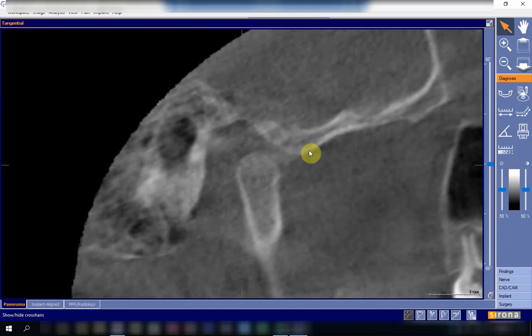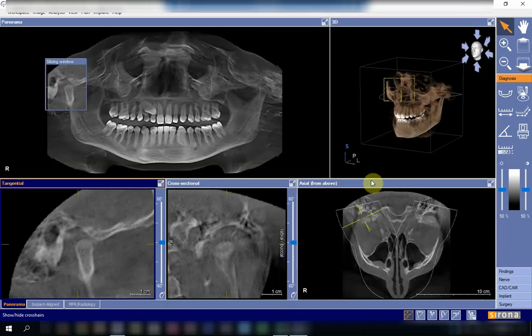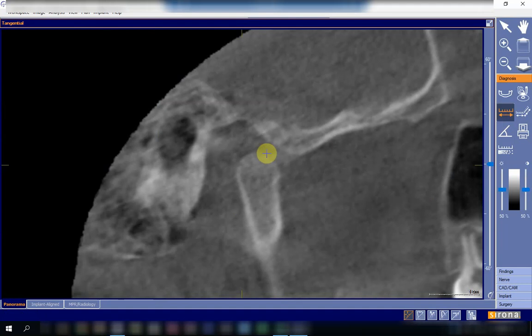You will look for the same criteria that you were looking for here. One is the integrity of the surface, no pitting, no erosion, and the space. If you go to both sides, we can measure this. I just want to confirm we can measure this area from the superior surface to the maximum depth of the fossa, articular fossa, sorry, in the temporal bone. This is 6.7 millimeter.